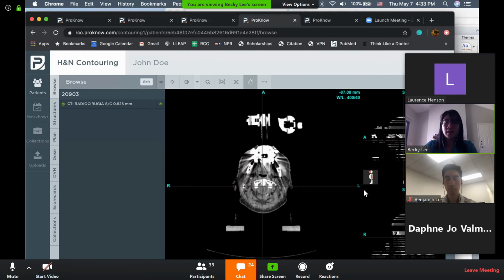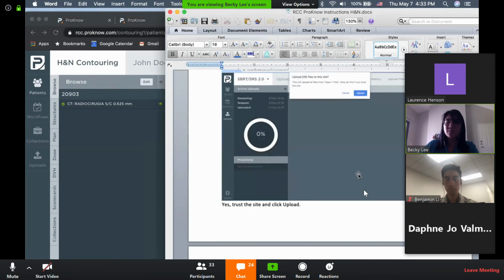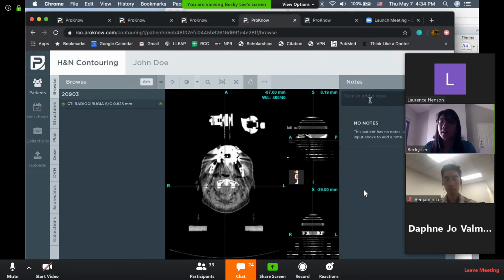Okay, are there any questions about uploading? That pretty much is what this file goes over. In the meantime, you can explore while you're on the website. You can add additional information. You see his name's been changed already, but if you have any notes you'd like to add, so if you want to say, this is a 54-year-old gentleman with oropharyngeal primary with, et cetera, you can write their clinical course if you'd like. If you want to attach a document, or images, or whatever you think would help with the case, you can go ahead and upload it here. There's an upload button. You can upload straight from your desktop or wherever. All good?